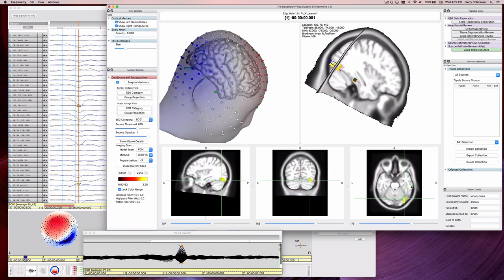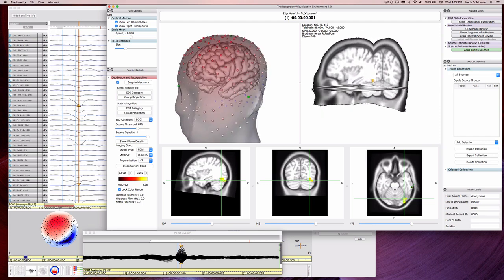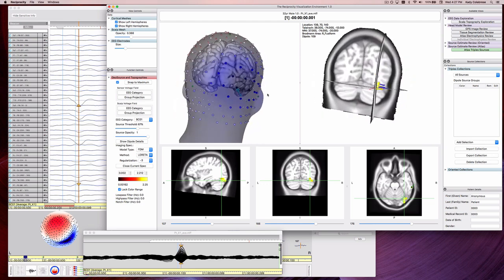The MRI view shows the vector direction as always pointing toward the positive end of the vector. Therefore, the vectors in the 2D image should be pointing in the same direction as the red end of the vectors in the 3D image.